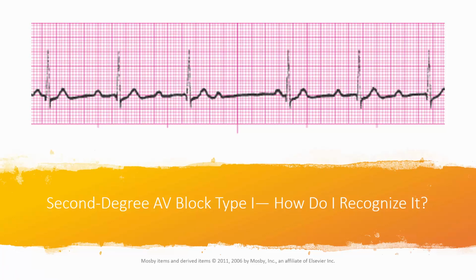Now let's go and look at that PR interval. Okay, so start with the first complete PR interval you have, and it's right here. Okay, so we're looking at this PR interval right here, and then I want you to compare it with the other PR intervals.